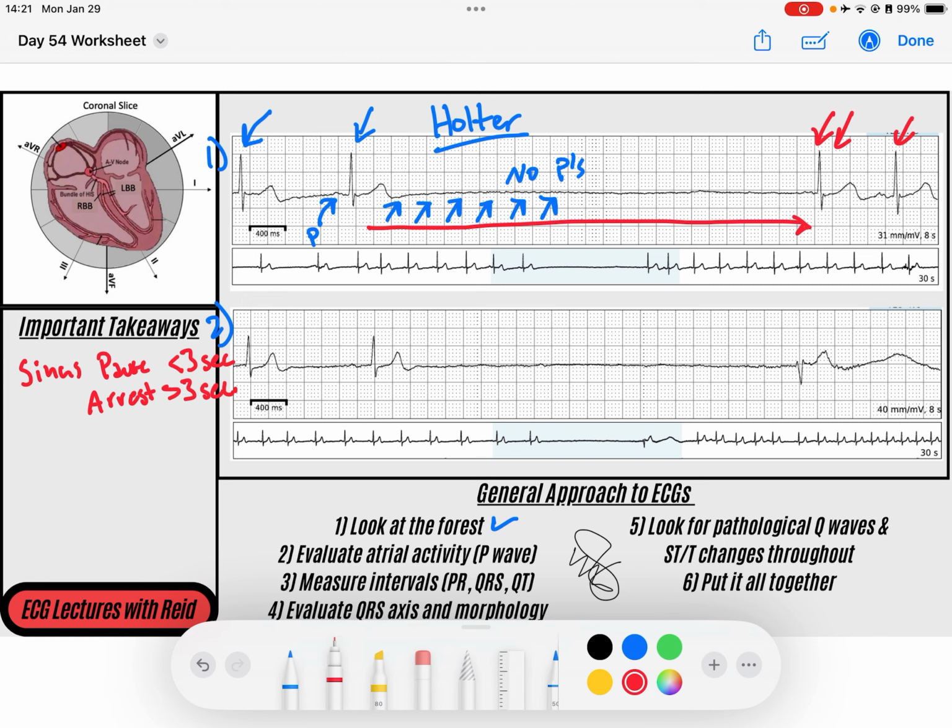And what does this beat do to resume? Well, I see that we've got a P wave that occurs before the QRS, and then we have another P wave here before a narrow QRS. So what can we designate this pause as? This pause here that we saw throughout would be a sinus pause. And then we see a resumption of our sinus node. So we have a brief sinus pause, and then let's take a look at our next strip.